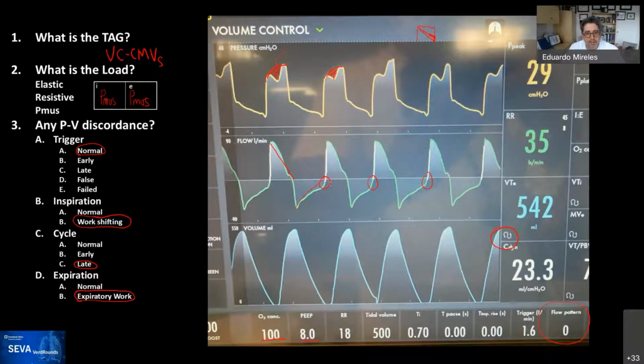In this pattern, in which there's a transition from active exhalation to active inspiration, there's going to be a rapid change in flow. And although there could be auto PEEP, this is not the way to detect it. You will not be able to detect it under these circumstances because of the transition.